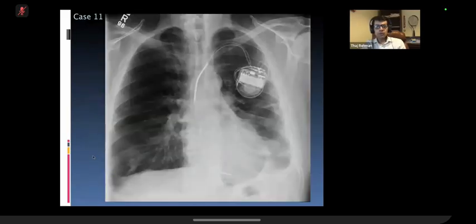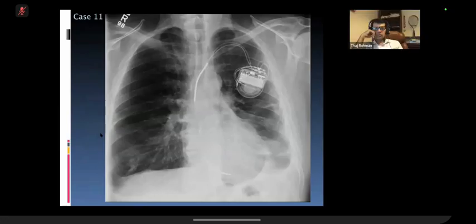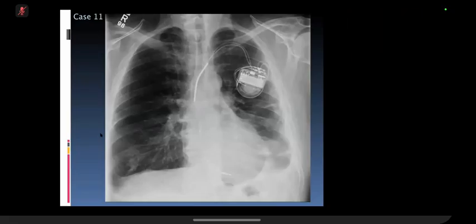So this is a post cardiac pacemaker X-ray. Okay, this is a frontal chest radiograph of an adult patient. There is an ICD device in situ. There are some changes in the left base, but these appear chronic. Given that it's post pacemaker insertion, looking for any pneumothoraces, it goes on and off in terms of being blurred, but I don't see any large pneumothoraces, especially on the left side.